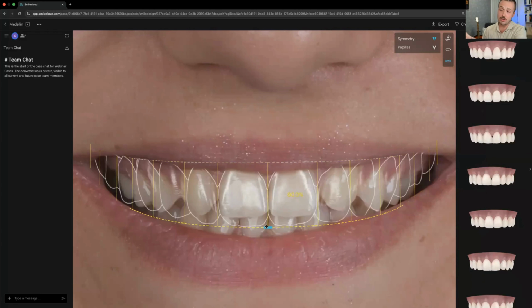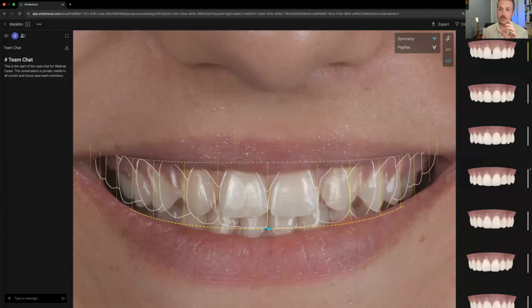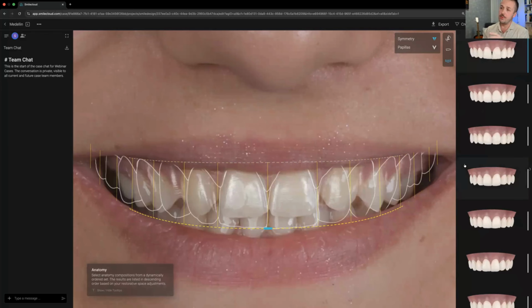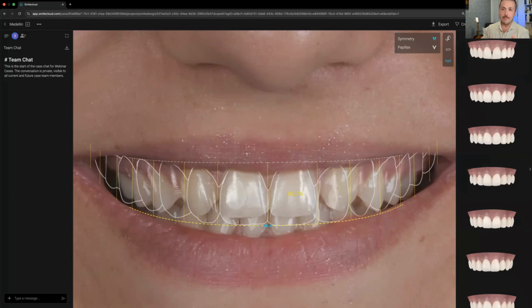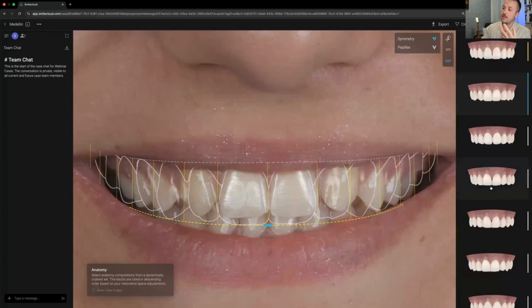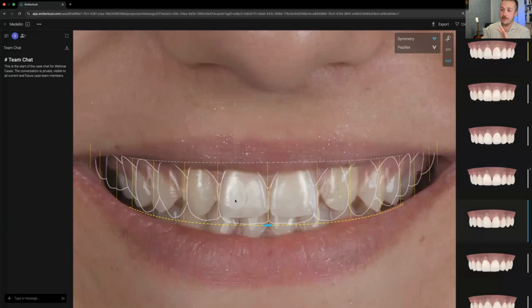So by changing the information, let's say the type of the grid, and giving this information to the software, it will also give you possibilities of new teeth. So it's like a living environment where, when you're changing the frame, you're changing the possible outcomes. And the software will immediately give you certain options which you can easily select. But you can see in this design, this is obviously not good.